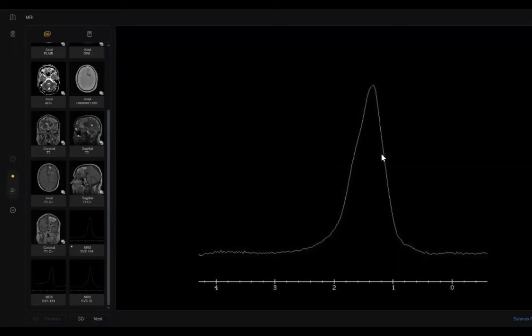Sir, I will correlate this peak with the other. Look, one second. This is one peak only of one item only. What does it mean? The answer is in this image. Where is the peak of choline? Where is the peak of N-acetyl aspartate?